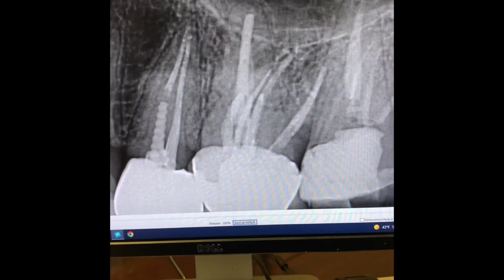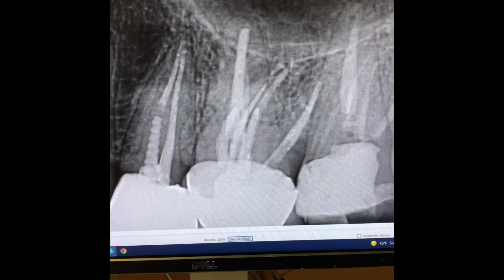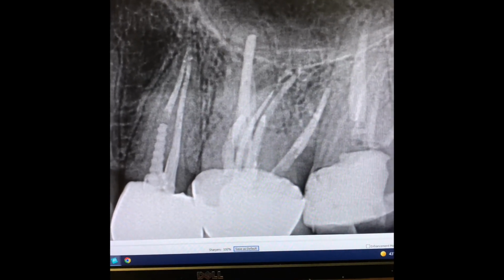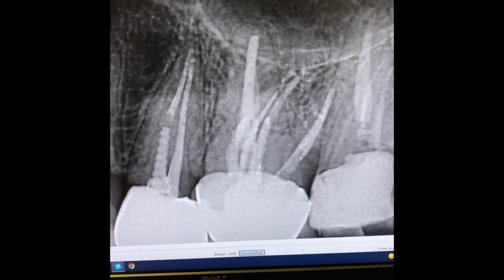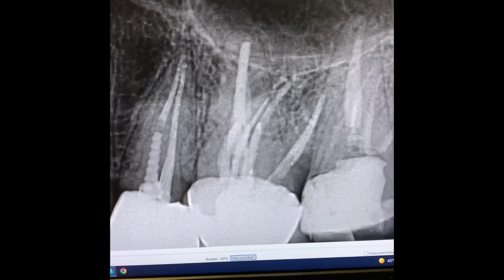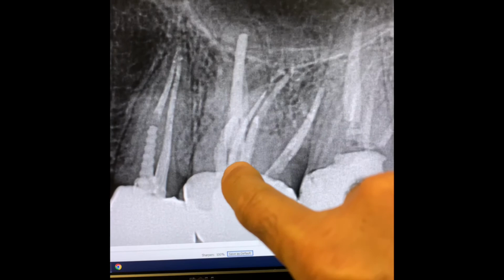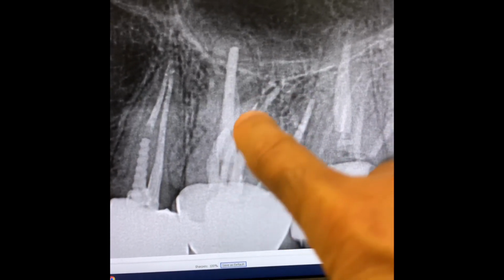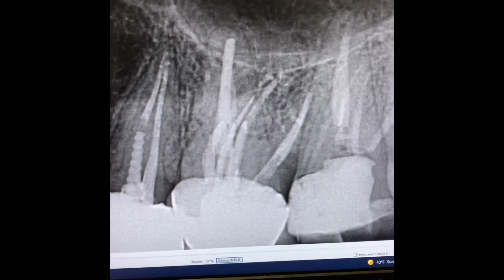So as you can see, the endodontist, even after taking multiple CBCTs, had still missed a canal and was going to do an apical. The apical, of course, would not have been successful because there was a completely missed MB2 system. So the apical would not have worked.